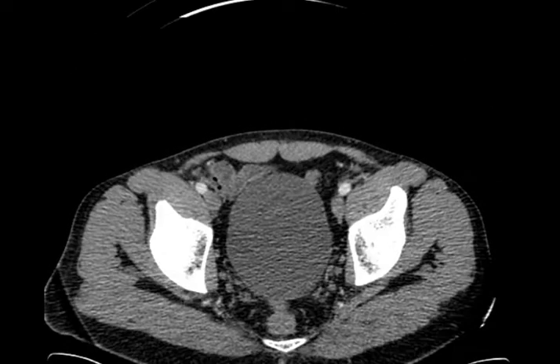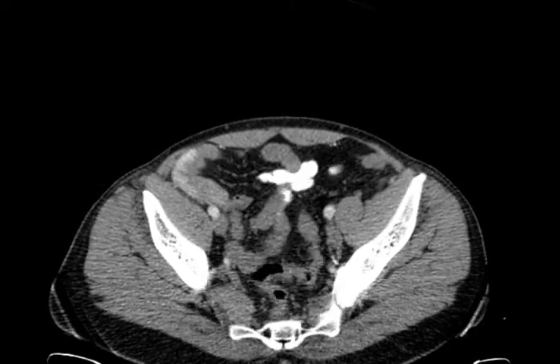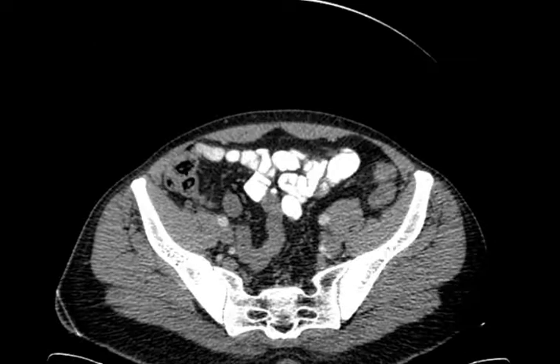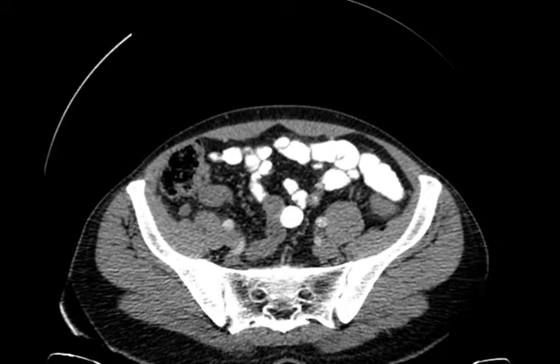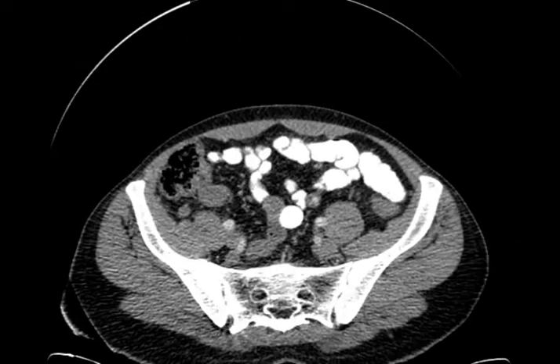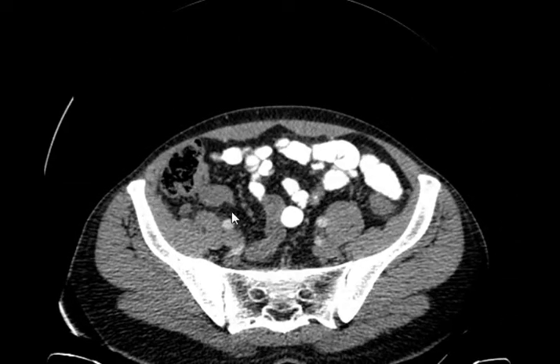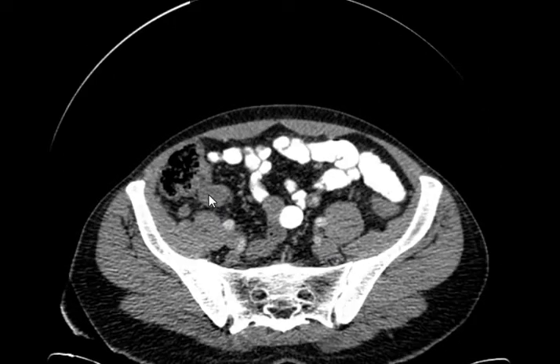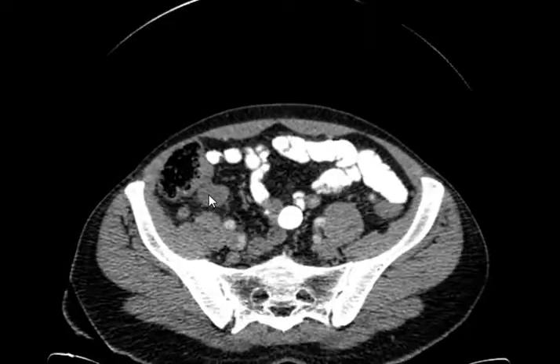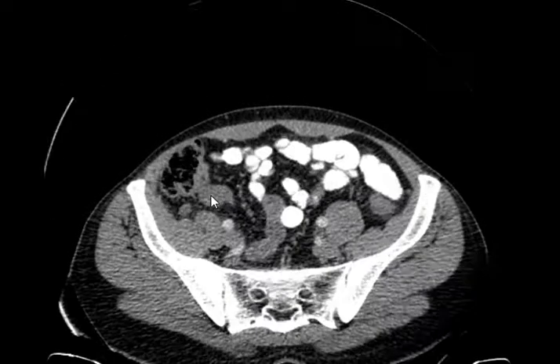Rihan, what's the cause of this guy's pain? Appendix, I think, was dilated somewhat. Where is the appendix? This is the appendix. No. Where is the terminal ileum? The posterior. One minute. Where is the terminal ileum and where is the appendix?